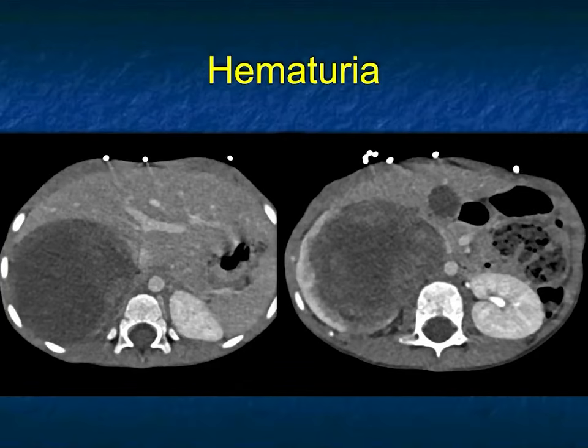This patient has hematuria, and I'll tell you the patient is 10 years old. Now, when you look, you say, well, could this be adrenal pushing down? And if it was a 10-year-old with an adrenal mass, I would have said a neuroblastoma. But the mass really does look, particularly on the image on the right, like it's coming from the central portion of the kidney. Now, if the patient had sickle cell disease, usually as teenagers, they get these medullary carcinomas.